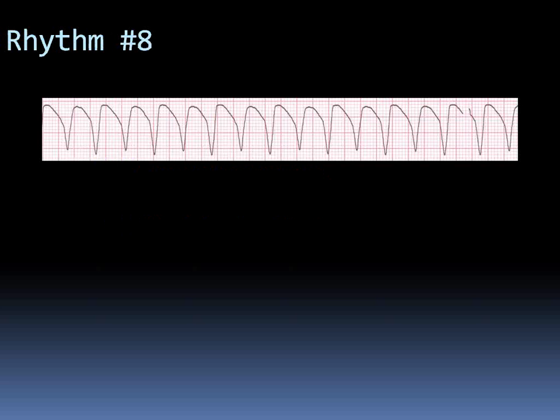So we went over this ECG before too. What do you guys think is going on over here? It is a wide complex tachycardia. The QRS is extremely wide, and it is very regular. It is a recurrent pattern that is very, very regular, and the QRS is extremely wide. This is the width of the QRS. Good. So this is an ECG of a patient in VT, or ventricular tachycardia.